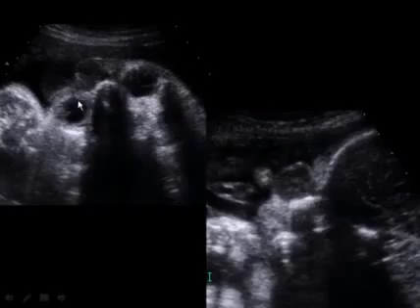Here's an image of the orbit in a patient. This is why we're looking at the orbits, because in this instance, the two orbits and the nose, there's a big soft tissue mass here protruding from the anterior aspect of the nose between the two orbits. And here it is seen on the more sagittal plane, and you can see that the tissue here is identical in echotexture to the tissue of the brain, and this is an extra cerebral glioma.